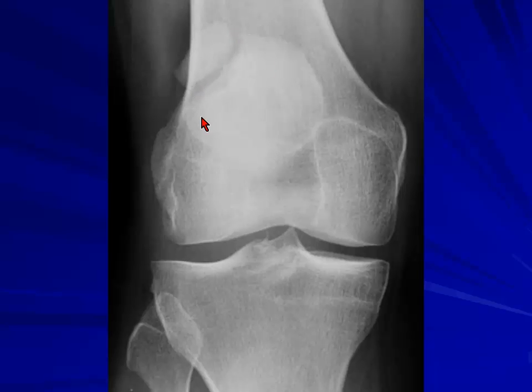When you're looking at the bone scan and when you're going to report the knee, you need to be aware, and I've learned with time and with discussion, that if you see diffuse uptake, then you don't need to be bothered about reporting, because normally that's what you see. But as said, it can be arthritis, but nobody's going to intervene. But if you see focal uptake, that is very important, and especially when you're doing a SPECT CT, then you need to report that, because that could be the pain generator. So it is very important.